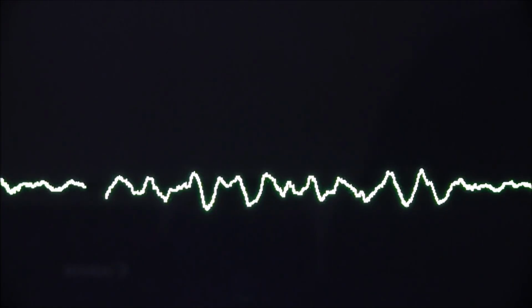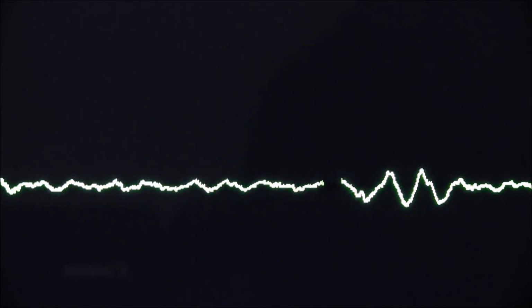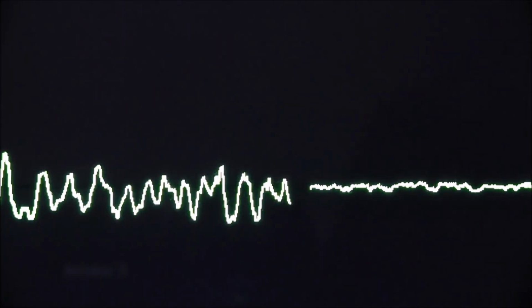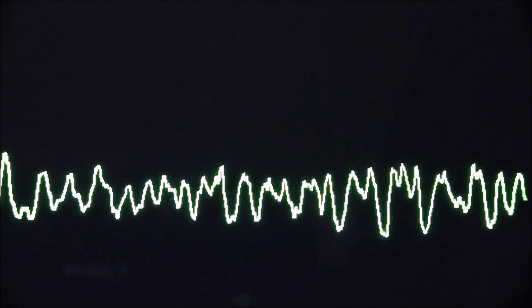The finer it is, the more difficult it is to respond to defibrillation. This version is quite a lot coarser now, so it should respond to defibrillation more readily.